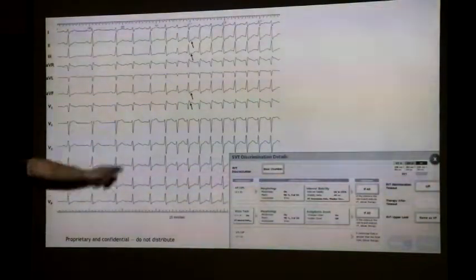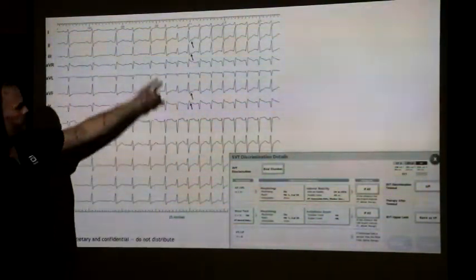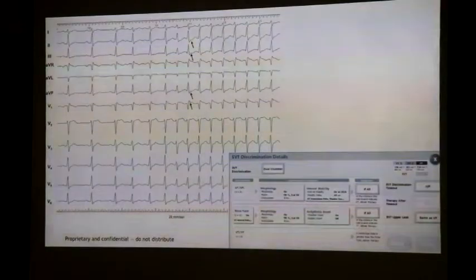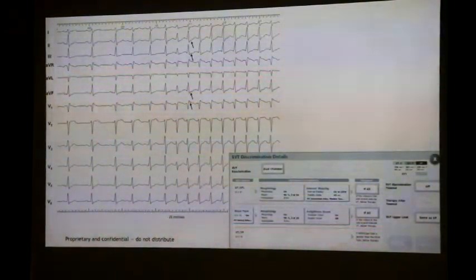Sinus rhythm, sinus rhythm, sinus rhythm, sinus rhythm, something else, something else, something else. And then to read P waves, I've got the arrows on them, and it's in V1. Like an AVNRT. This is an AVNRT, right? What started the AVNRT? The premature beat. A premature atrial beat.